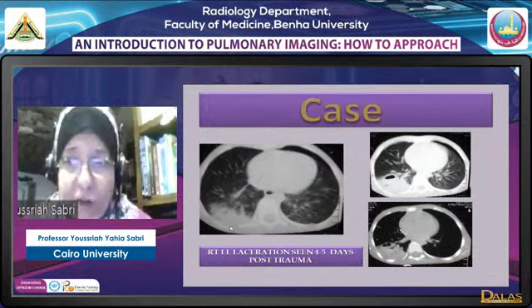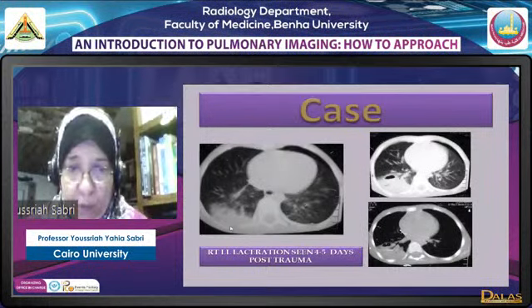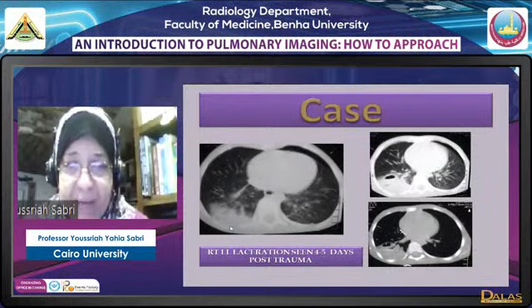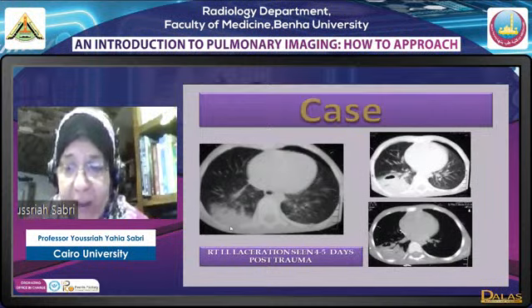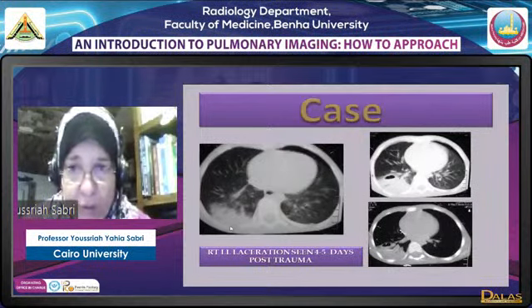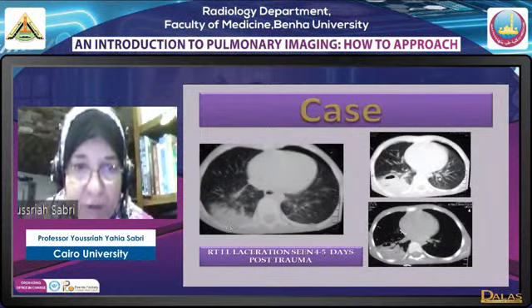Laceration will appear 4 to 5 days after trauma at the site of trauma, okay, and it will appear as a peripheral consolidation that shows cavitation within, and by time, as we have seen before, it will heal, leaving a cyst that will decrease in size by time. So a laceration is one of the appearances of unilateral peripheral consolidation.